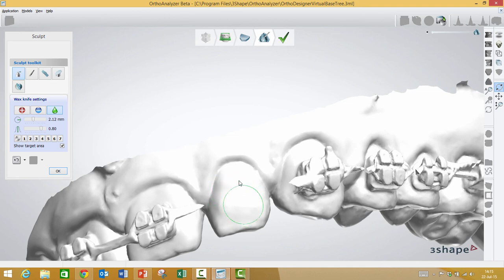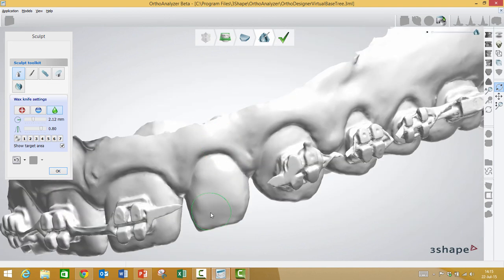simply smoothen the tooth up. Pretty cool. You have a nice result of the debonded bracket. Very nice. Yeah. Thanks, Heike. You're welcome.